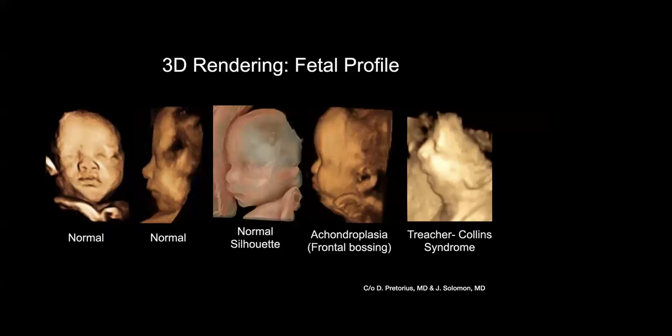And of course, 3D rendering, everyone does that. It's one of the most, I think, beautiful highlights that we do as an obstetric and MFM sonographer. For those parents, they really appreciate it, right, to improve that fetal bonding. But at times, it's really helpful when you think about it.